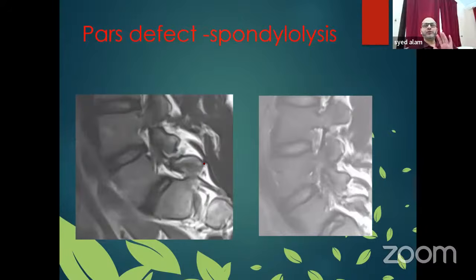And this again I put intentionally because this is one of the young people. When young people have an MRI where there's no disc problem, the pain is because of the facet defect, the pars defect. So we should catch that. That is very important because the patient has pain, and nowadays everybody can afford an MRI.